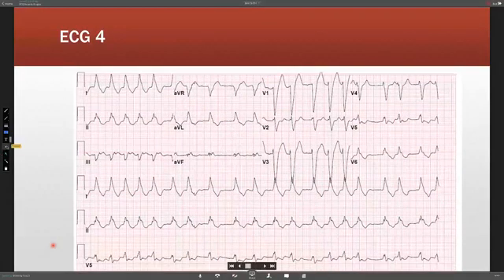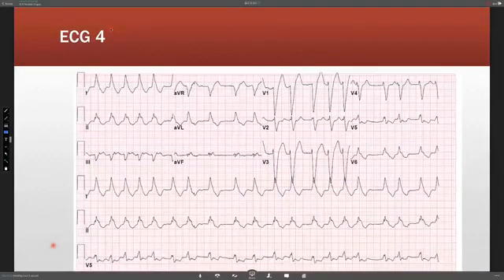Yeah, can I comment to Yousef? Yeah. A very, very nice EKG. The problem in this EKG, sometimes if the patient has a lot of this part of the EKG here, the first part, then people might call it VT. Yeah, if you look at the first part, it looks almost regular. Right. That's why the longer you look, you see some variation. If you measure the R to R, there's going to be a subtle variation. Right. Very nice. But overall, there's a typical left bundle morphology. Right. And this is someone who has a cardiomyopathy, kind of a sick heart. Yeah, very interesting.